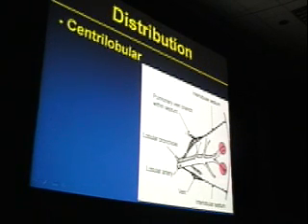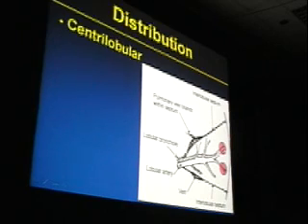And on high-resolution CT, we can often distinguish that processes are distinctly centrilobular in distribution, that is, occurring along this core lobular bronchiole and artery.